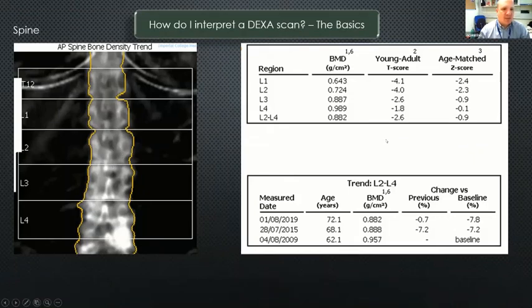If they start to jump, as is the case here, especially to L4, you can see it's suddenly gone to minus 1.8, the T-score. So you then look at the film and you think, oh yes, there's a big white splodge there. I think the L3 is probably okay to me, even though it has jumped by a fair amount from L2. So look at L4 and I say, okay, that's a bit of a vertebral inaccuracy there. And so what am I going to do about that?